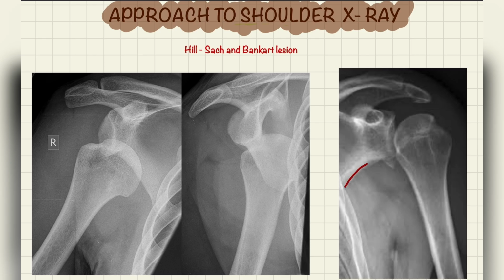On a normal X-ray, the glenoid cavity cortical line looks like this, a clear surface. There should be no bony fragment like we can see here. So while relocating the humeral head, this posterior surface collides with the inferior surface of the glenoid cavity, and this creates this bony Bankart. And that is why I was telling you to always move with the cortical line of each bone to rule out the fractures and different kinds of lesions.